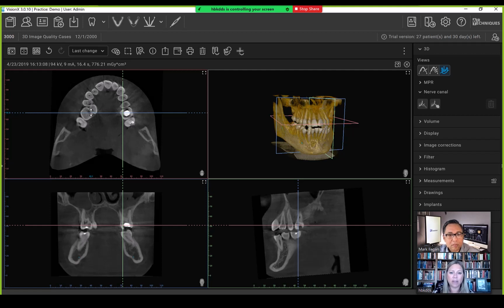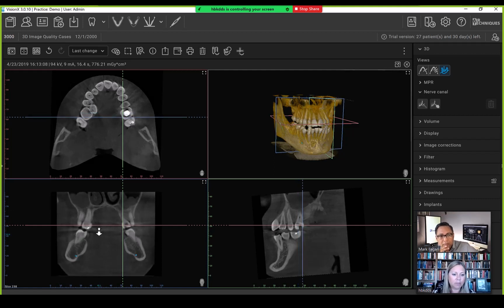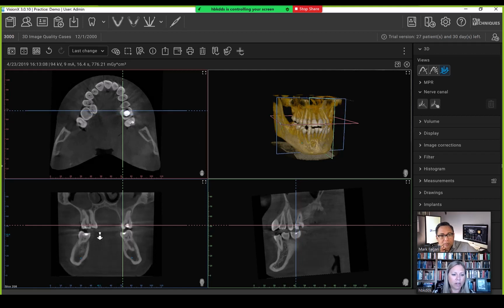My CBCT is amazing at everything else, but caries, I would say, very conditional. However, we might mention that it looks like we have some things going on, and you need to take some intraoral bite wings to accompany the CBCT to help rule out caries. Okay.